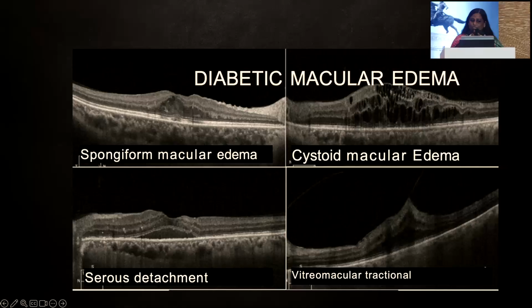Very commonly seen is diabetic macular edema. It becomes important to understand which is center involving. Some of the ones shown here are center involving. Non-center involving are typically not treated with an anti-VEGF, and center involving is treated with an anti-VEGF. Here you have different types of it, though we most commonly encounter a mixed variety of all this. We have spongiform, cystoid, you can see the cystoid spaces, serous, and tractional edema.